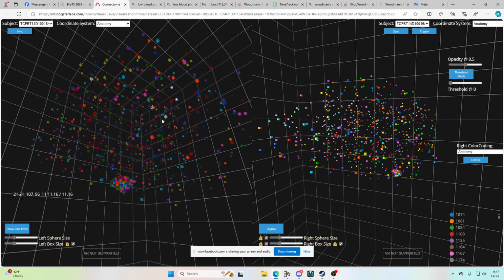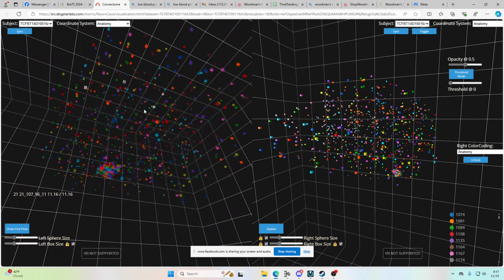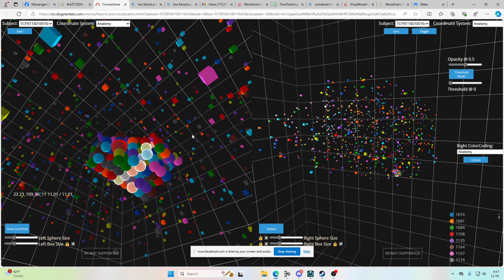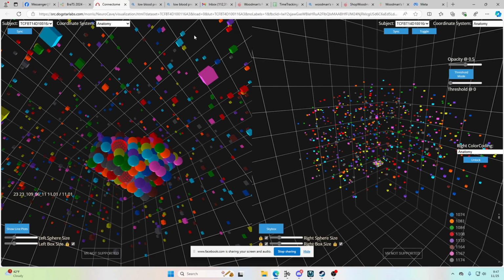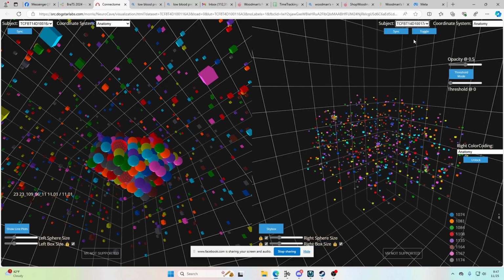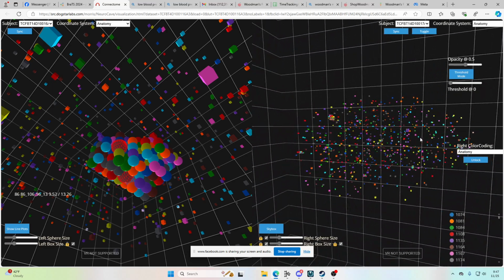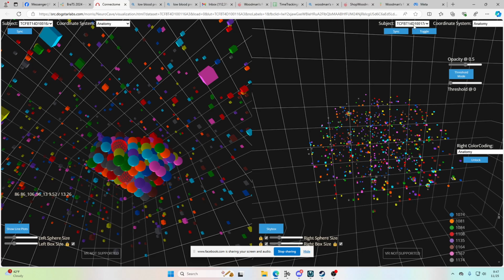So this patient has a big tumor right here and doesn't really have any other tumors. And you can use my software. It's got two windows, so you can compare two different tumors. So this is another data set. This is 10017. This is 10016.